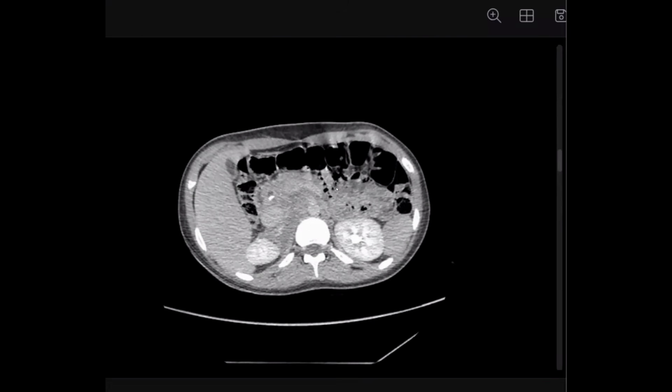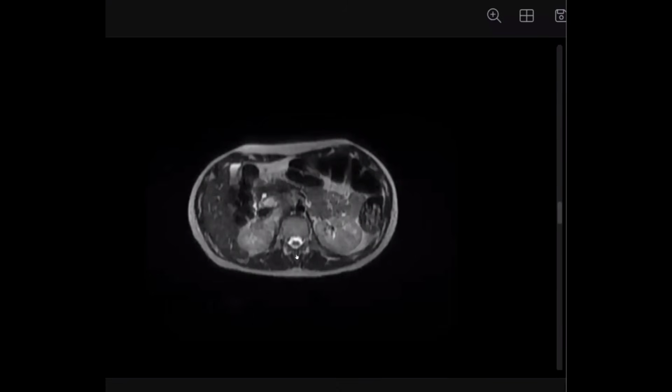What's your differential diagnosis? Considering the location as well as the imaging characteristics, had it been enhancing, it could have been a lymphomatous lesion, but as it is not enhanced, maybe lymphatic malformation? Yes, I think this is a lymphatic malformation because it is invaginating into the surrounding tissues. What else? I would like to compare with the previous imaging if available, and I would also like to check the Hounsfield unit of this lesion.